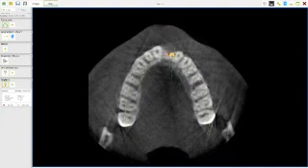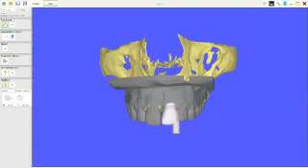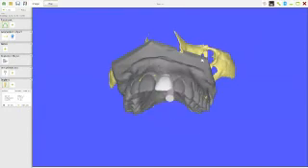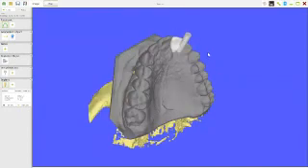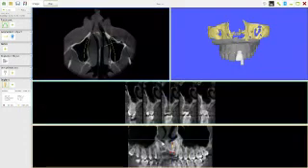But this would be angling it now. If I moved it like this, I've moved it into the side of the tooth now. It's actually tilted. And if I go to the three-dimensional view, I can show you this, you can see how it's tilted. Yeah? So we don't really want it like that. So we can grab hold of it here if we want, and I can move it back from this picture, or I can move it back from this picture here.